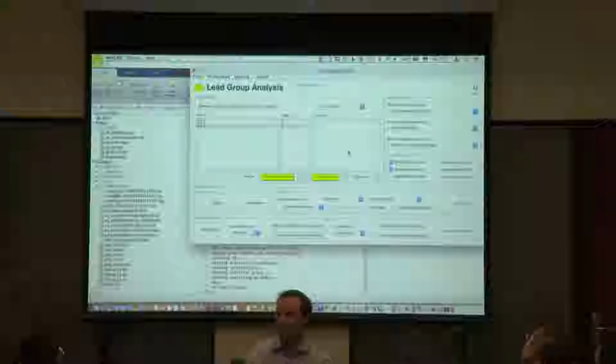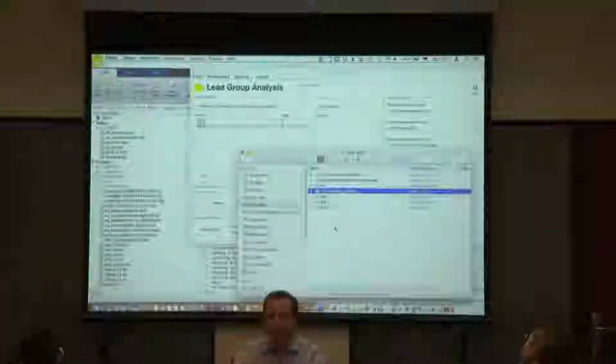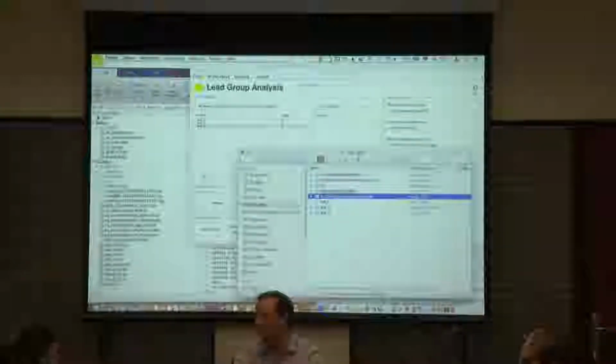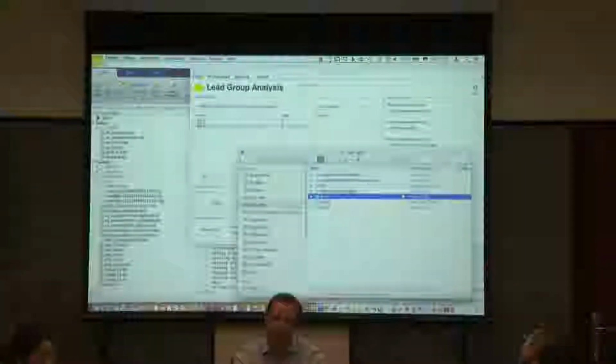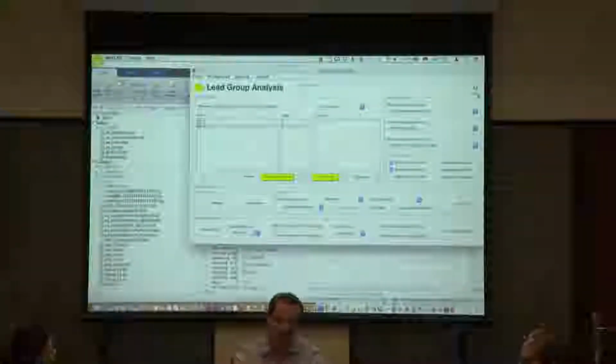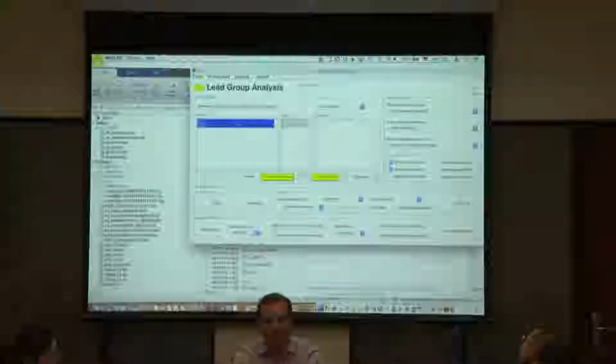It doesn't use the patient-specific data anymore. So usually a good idea is to make just a copy of this small folder and say this is the detached one, and then only detach one of the two, right? Because it's not easy to actually reverse this, once it's detached. Okay, but all the rest will still work. We have the detached analysis now. And then, exactly, we did that. Open them in Lead Group again, everything is fine.